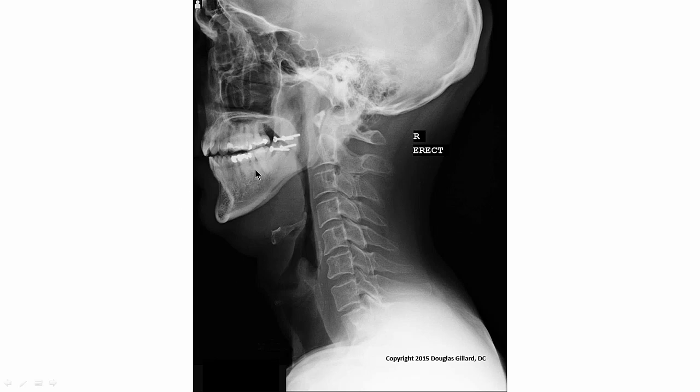Okay, the body of the mandible is here. Here's the angle of the mandible. See it curving? You can actually see this on an AP view. We'll see that later. And then this is the ramus. It's a little harder to follow, but right up in here, that's the coronoid process. Condylar process right here. There's the head of the condylar process, which makes up the TMJ joint right there.